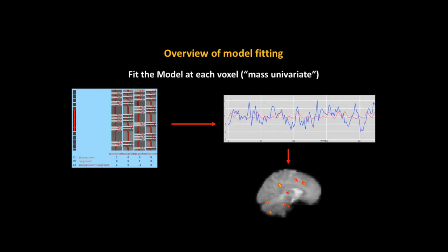And what you can see is in these lighter bands, that is when there's an onset of a certain condition. So we're seeing the HRF in response to each of these conditions when it occurs, and it goes back to baseline. And then if we superimpose our fitted model on top of the time series, this blue is the jagged, really messy time series that we get from the raw data, even after we preprocessed everything.